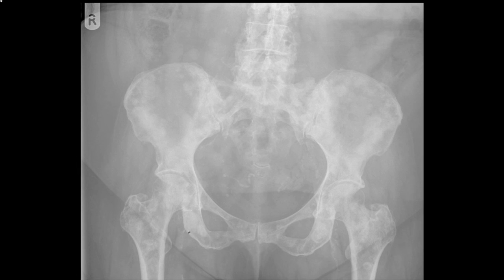So here are areas of dense bone bilaterally in both femora, in the pubic rami, too dense, and then the iliac wings have a more mottled appearance because of this density. Similarly, in the lower lumbar spine, it looks too dense. There are sclerotic lesions in the sacrum and in the pubic rami and in the lumbar vertebra. So why has this lady got sclerotic deposits in the bones to make them have this mottled appearance?